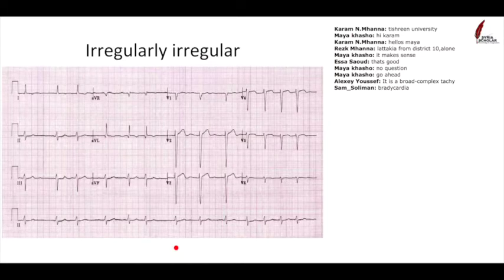This is a really important heart trace that you'll get used to seeing after a while. Just randomly spaced out QRS complexes with no P waves. This is atrial fibrillation.